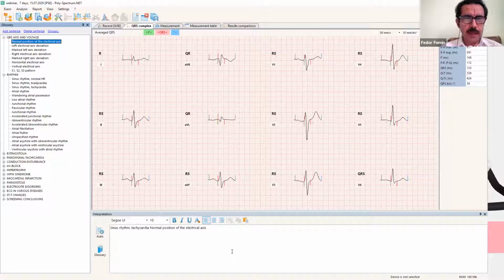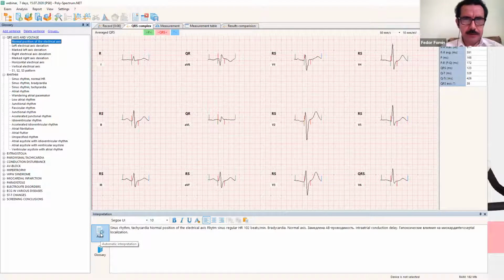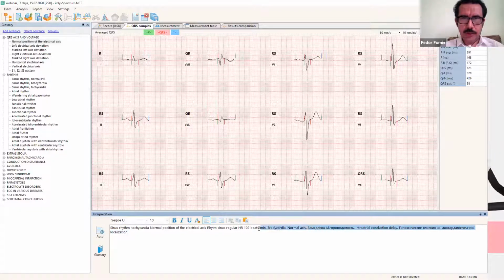So after that, this automatic feature is active for some regions. So you need to check this with our sales department. But I'm lucky here in Russia to have this feature that provides me some data. But unfortunately, because it's not intended for English countries, you can see some rubbish here also. So I can come back to my original manual interpretation.